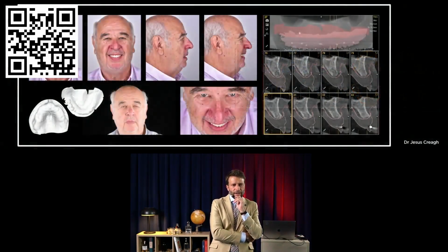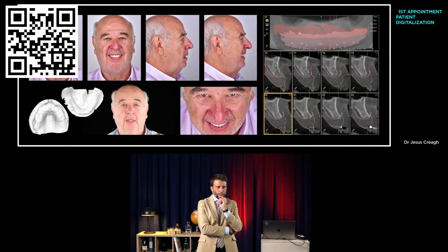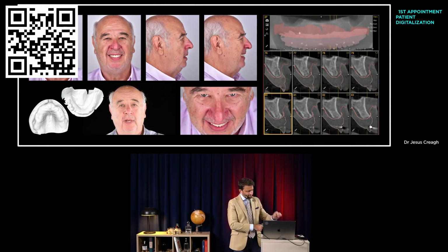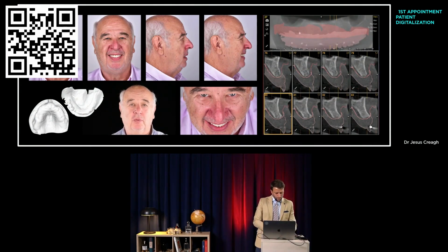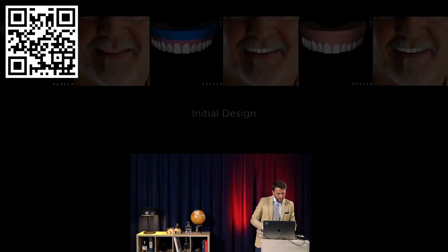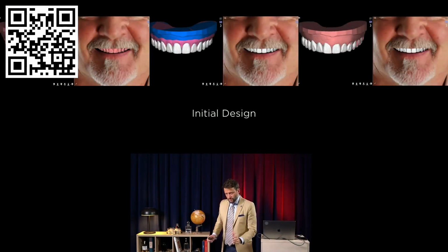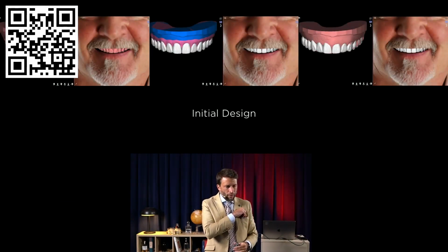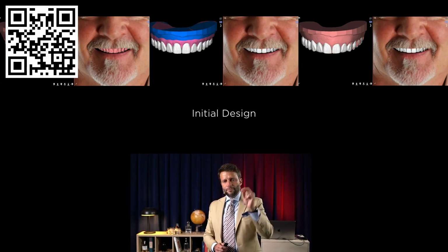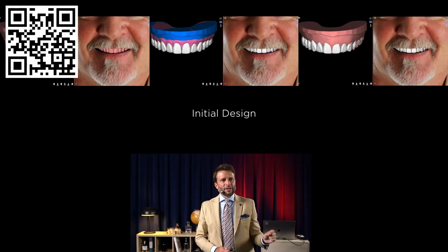Okay? I have a couple of cases that I want to share with you. Before I jump into the cases with the guides, I want to share with you a case that we did this week to show you the power of treatment planning. Look how powerful 3D technology is to help us make better decisions for our patients.